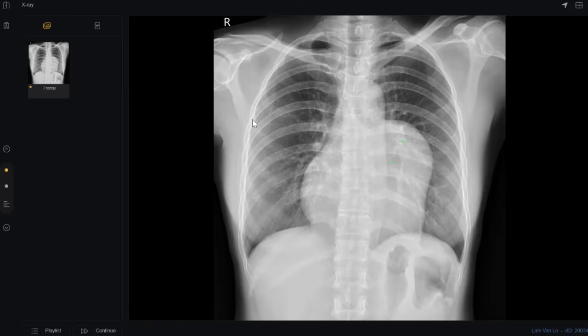However, I can see the descending thoracic aorta and aortic knuckle separately. So it is basically an anterior mediastinal mass. I cannot see any differential density in it, and there is no calcification. So in summary, the findings are of an anterior mediastinal mass.